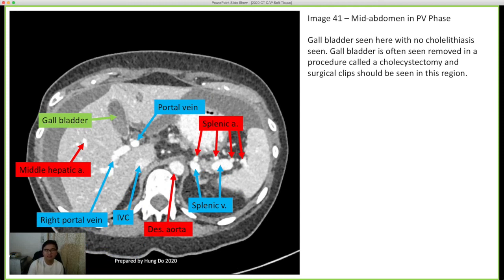Remember, the portal vein system is independent of the IVC. That's why it's called a portal system, because it's not related to the IVC. The portal vein drains all the venous blood from the upper stomach, from memory the entire spleen, and the upper ileum, into the liver for filtration, and then the hepatic veins, the veins themselves of the liver, drain into the IVC complex.